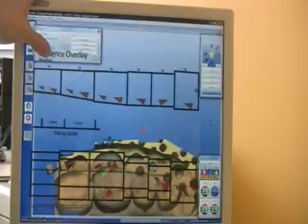Turn on our antagonist. And when we have the antagonist on, if we were using our Form Minus tool, we were able to remove the material on the proposal just down to the surface of the occlusion. This is one of the nice things that 3.8 has brought back. It makes for very quick manipulation of the occlusal.